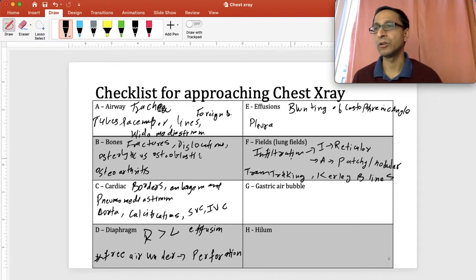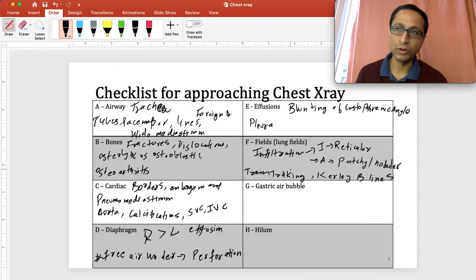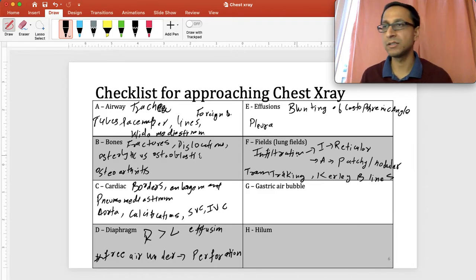And in the lung fields, you can also look for, of course, a pneumothorax. Pneumothorax, we've talked about it in a lot of different contexts here, but pneumothorax, cancers, tumors, and even granulomas. So all of those could be found in the lung fields.